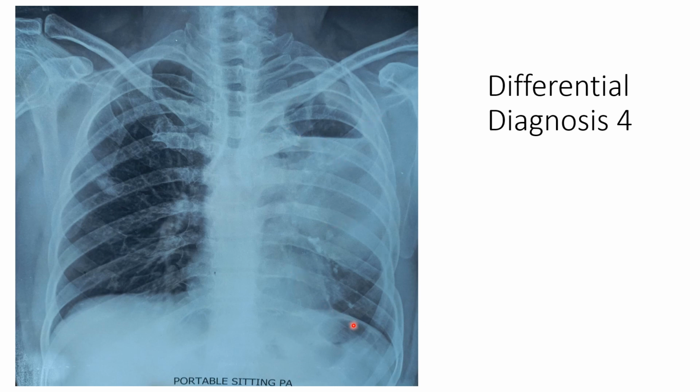But now you see the lung margin beautifully up here. So it is not hydropneumothorax. So it is again a cavity. It is a large cavity with an air fluid level and with a surrounding consolidation. So this is all consolidation. So this is surrounding a cavity. So it is not fluid, because had it been fluid, this CP angle should be blunted, and all these things should be obliterated, and it should be full white, right? So it is not there. You're seeing the lung here, so it is a cavity with the surrounding consolidation.